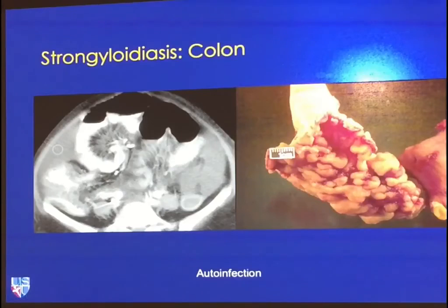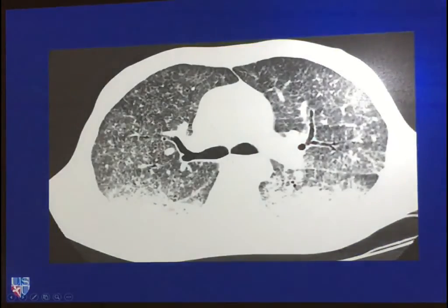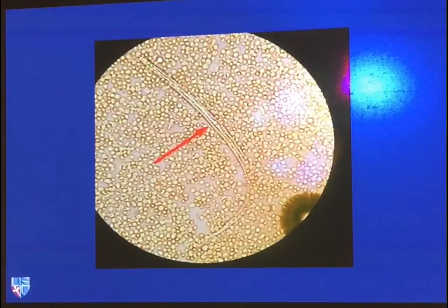Not only can the small bowel be involved, but the colon can be involved. This is also the acute disease with the polypoid pattern on the gross specimen. Polypoid wall thickening here. Angry bowel leads to ascites adjacent to the angry bowel. This case also had pulmonary manifestations where we had bilateral pneumonias and numerous ground glass nodules throughout the lungs. They had an effusion, which was tapped, and it became a hemorrhagic effusion.